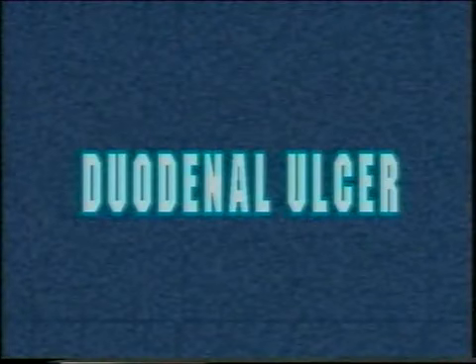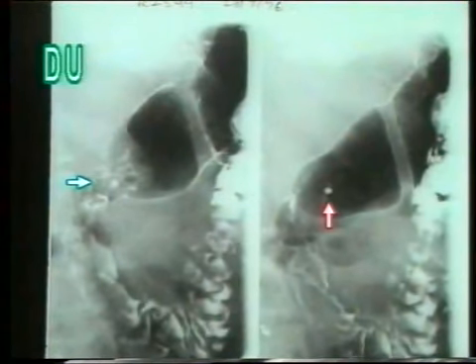A chronic duodenal ulcer. A chronic duodenal ulcer can be diagnosed with fair accuracy on studying the duodenal cap, first when it is distended with barium and later after it is partially empty. Note this ulcer crater which has retained barium in its base.